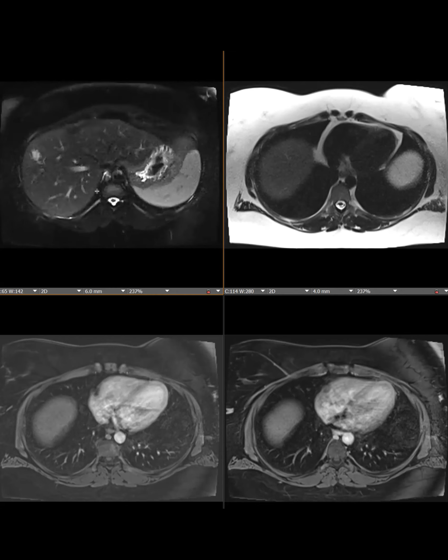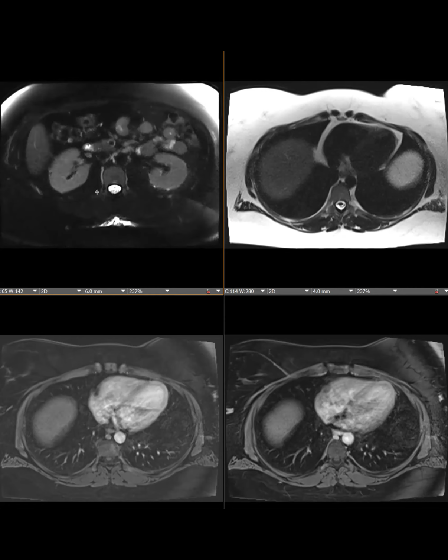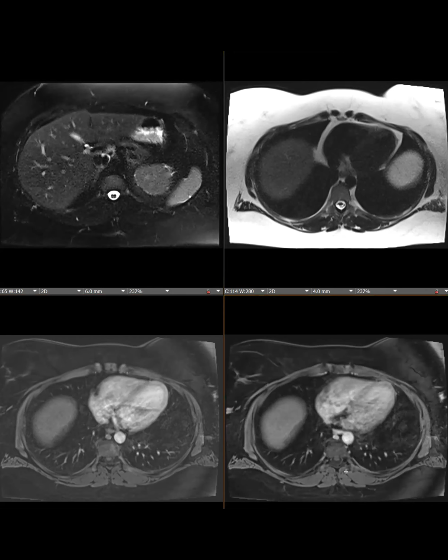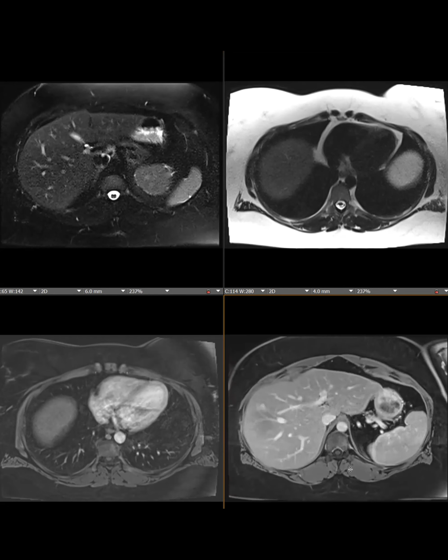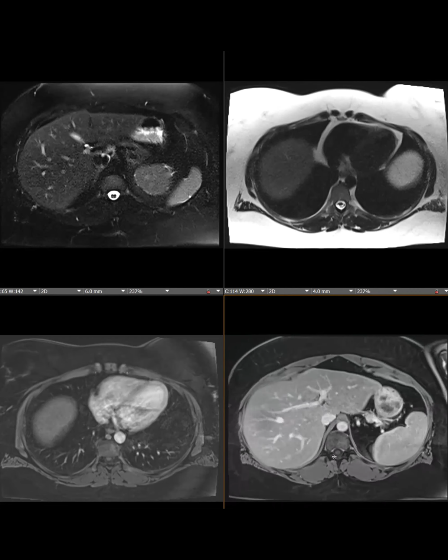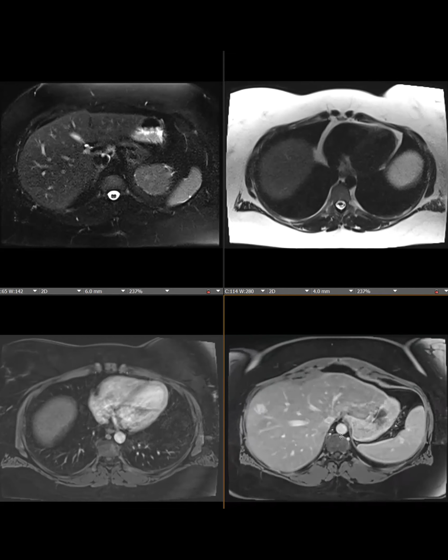Okay, and that's pretty much what happened to me as well. So I guess the next sequence I can go over, well, I'll go over the arterial in a moment, but this is a 5-minute delay, and that T2 lesion enhances, so you can see that. But what I didn't see is there's another lesion right there. And so I did miss that.